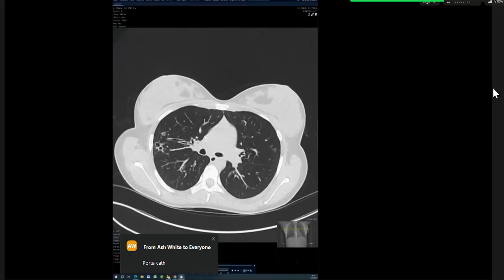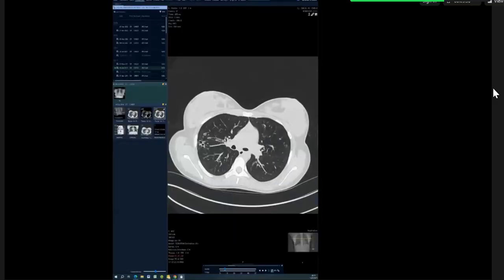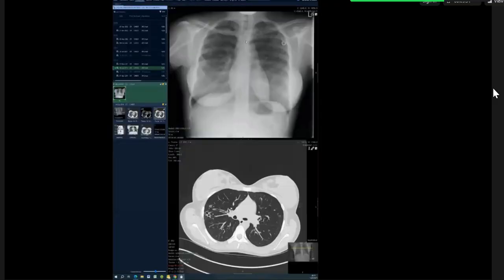I think you picked this tiny lesion as well on the radiograph, which was good. Yeah, bang on. I think the portacath is a hint, but you can't say I got the case because there's a portacath. It's a subtle hint. So you can't bank the diagnosis on the fact the patient has a portacath. You can say it later on, but don't let it be the reason you say cystic fibrosis. Although that's why we all do it, but let's make it not that obvious.